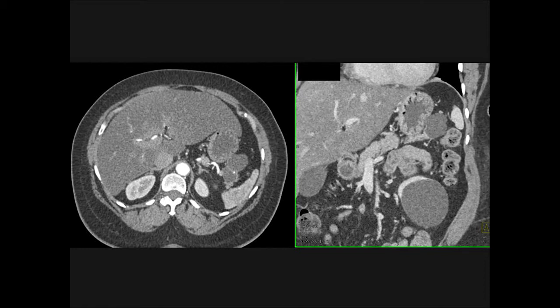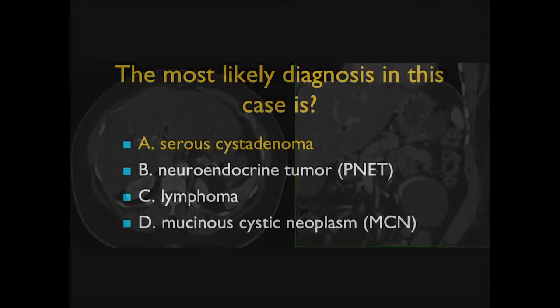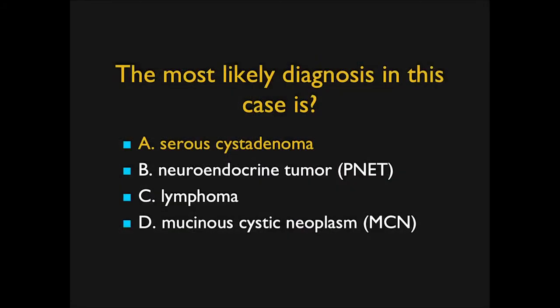This ended up being an oligocystic serous cyst adenoma. So again, serous cyst adenomas have a range of appearances, and at times they will fool you because they're just simply large cysts. Look like IPMNs, more common in the head of the pancreas, but can occur anywhere.